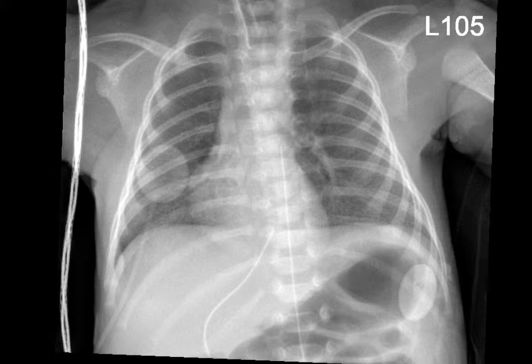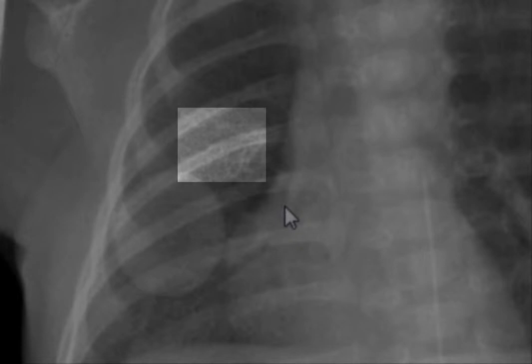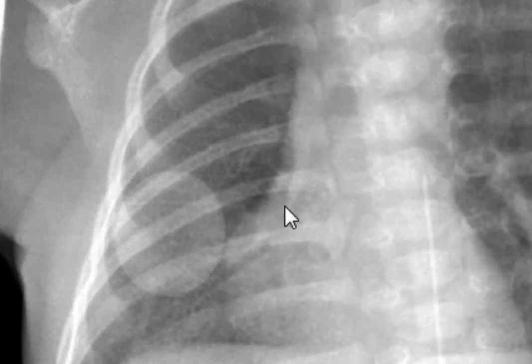All barotrauma initially starts because of areas of interstitial emphysema, and this is the least common example of interstitial air. That's when you have focal rounded areas of lucency that look like air-filled cysts, but there's no reason to suspect a congenital cystic lesion like CPAM. Generally, those patients are already known before birth because of the maternal ultrasound that usually reveals these lesions. But if you see a patient that has a rounded or multiple rounded cystic lesions, always consider that it's focal interstitial emphysema before you start thinking of congenital etiologies.